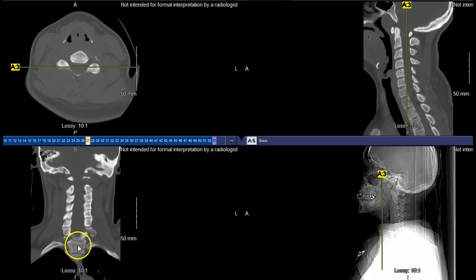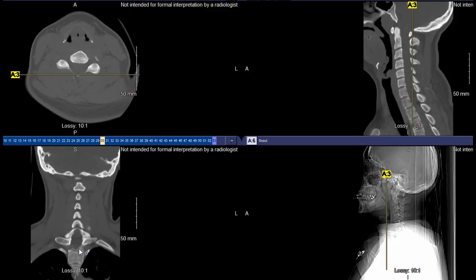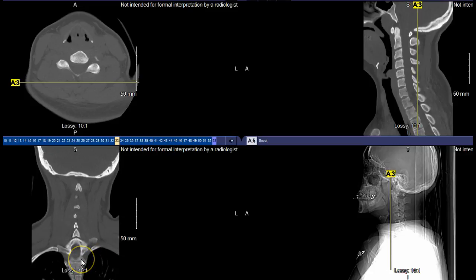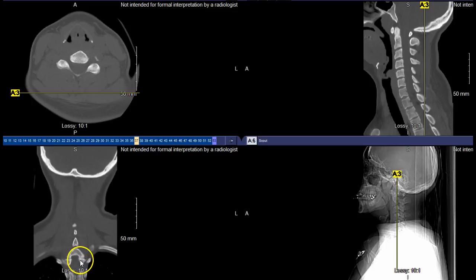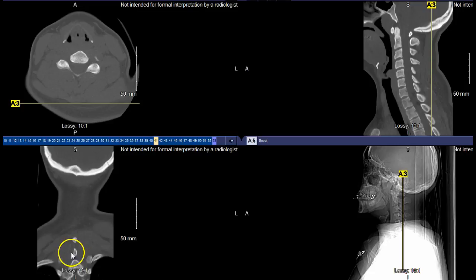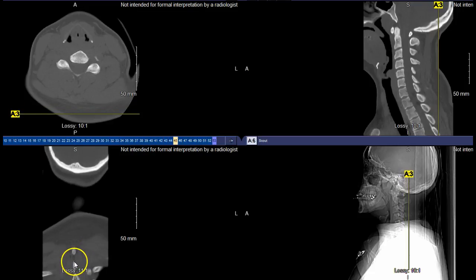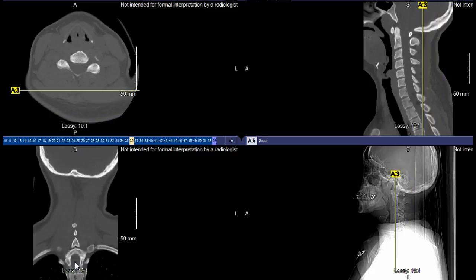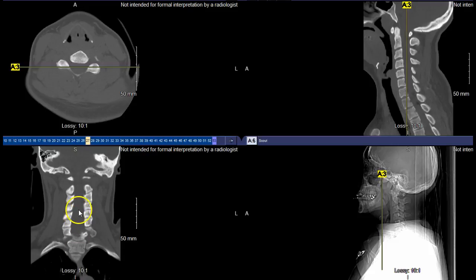So you can see those articulation points there respectively as we continue to go more and more posterior for these images. And you can subsequently see other ribs coming through on that posterior aspect for those additional thoracic vertebrae that are being demonstrated here. You can see those spinous processes just sticking out. So as we go really posterior, you can see where those spinous processes are. And of course, we can also palpate those regions ourselves. So hopefully that helps orient yourself a little bit.